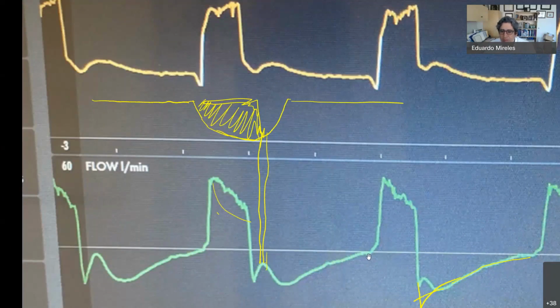If this patient had been on flow, you asked that, or somebody asked about switching him to flow, you can see that the patient already crossed the 0 baseline here, and it had to go all the way up here to actually start the breath. So if this patient had been on a flow trigger, perhaps the trigger time would be smaller, if that makes sense.